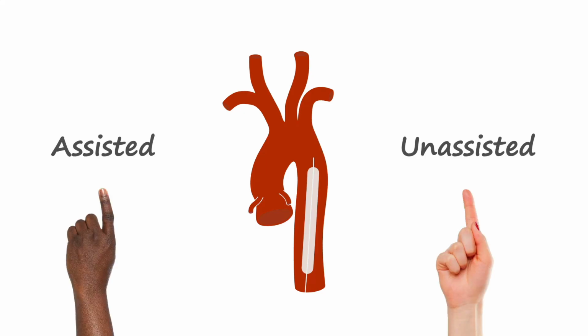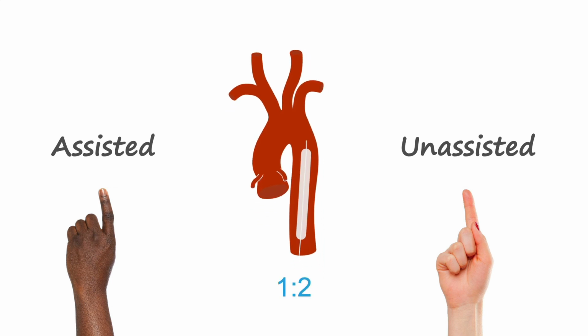When using a balloon pump in a clinical setting, it can be very difficult to see the subtle differences in assisted and unassisted pressures in the 1 to 2 mode. So, we often put the pump in standby mode to see unassisted hemodynamics and compare that to when the balloon pump is in 1 to 1 mode.